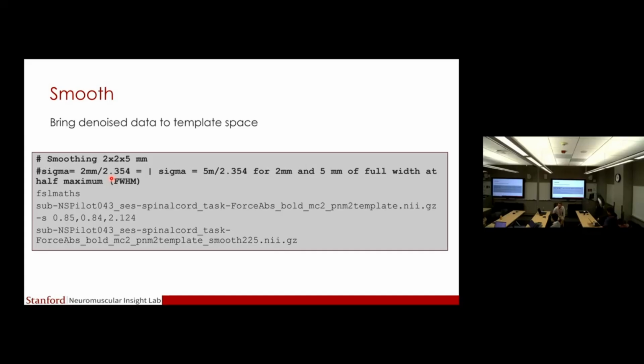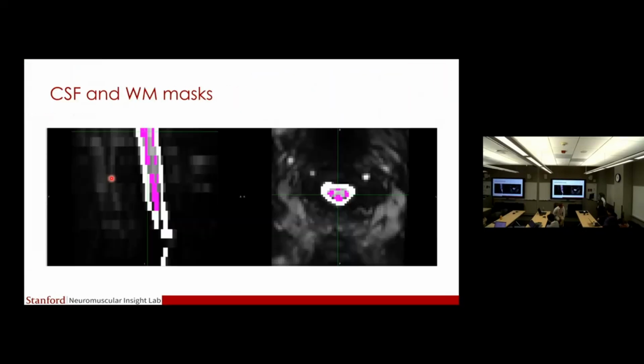So if I want to bring this to my native space, and if this is already a few voxels, and if I already have this in 2mm resolution, I would have maybe one voxel for white matter, and I wouldn't be able to distinguish. Well, smoothing done after the registration has a similar effect of introducing spatial correlation.